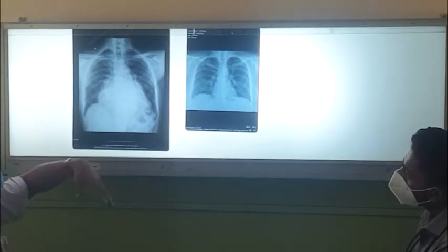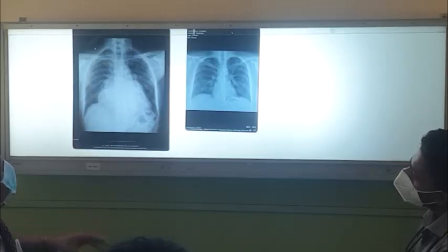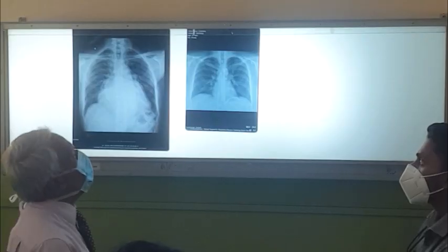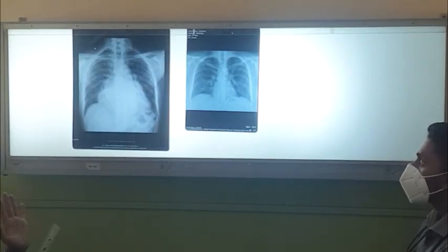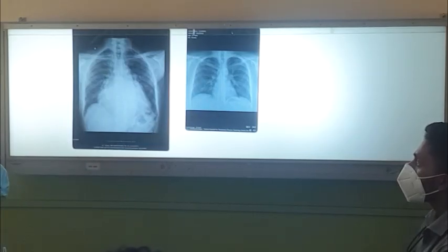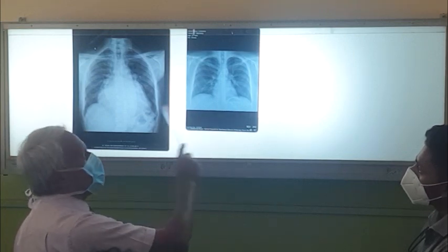So he has everything. So this is my turn. I didn't talk about these cardiac appearances. So when you do your cardiology appointment, learn about different patterns in the heart, right? In hypertension, you get a globular dilated left ventricle, right? In tetralogy of Fallot, you get something like a boot-shaped heart, right?